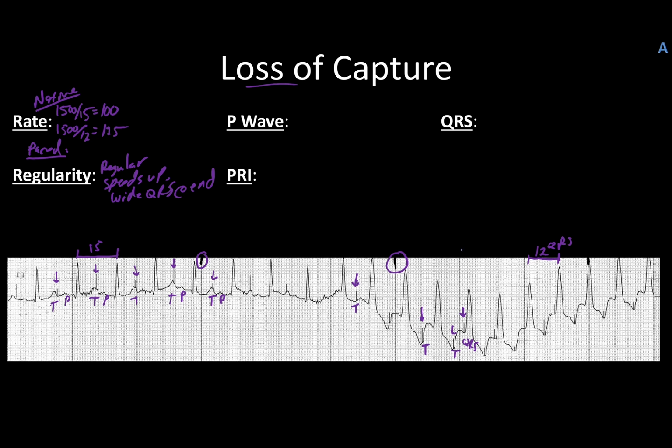And so if I saw this beat alone, I might think that the pacemaker was responsible for stimulating that QRS. However, this next beat here doesn't show that at all. There's no pacer spike to be seen. And that's what makes this strip confusing and challenging: what is the pacemaker doing? What is it responsible for in terms of generating depolarization for these patients?